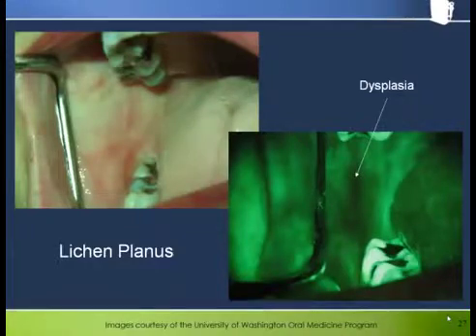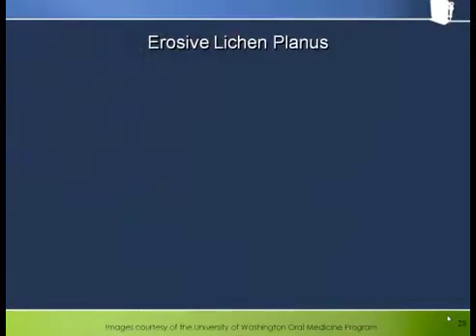As it turns out, in this particular case, dysplasia was indeed found in the upper part of the lesion where the arrow indicates in the fluorescence photograph. Notice that this particular area doesn't seem to stand out as much under white light.